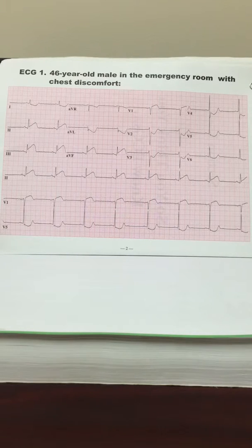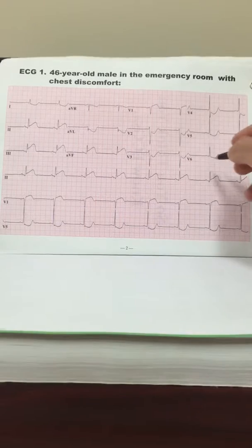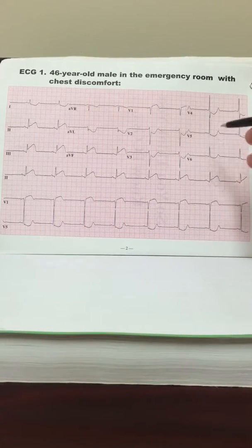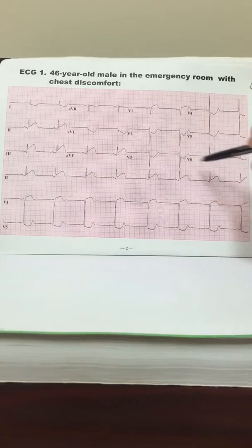Basically, it'll be when you have a P wave that has a higher amplitude than normal, which you'll usually find greater than or equal to about three small boxes, indicating right atrial enlargement. In this case, we do not have a high amplitude P wave. Another thing that's good to look for is P mitrale.